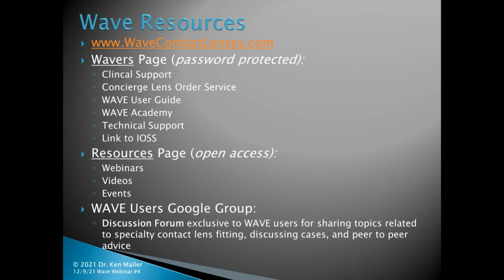Perfect. Thank you for that explanation. That makes a lot of sense, and I think a lot of people will find that very useful going forward. The next 2 questions both have to do with the way that you measured the elevation differences and the elevation toricity at the 7mm chord. The first question is, why a 7mm chord as opposed to, say, a 9mm chord, an 8, or even a 5? And the second question is, do you have any specific cutoffs that you use to distinguish between R-Sym, G-Sym, and freeform, or do you use your best judgment?